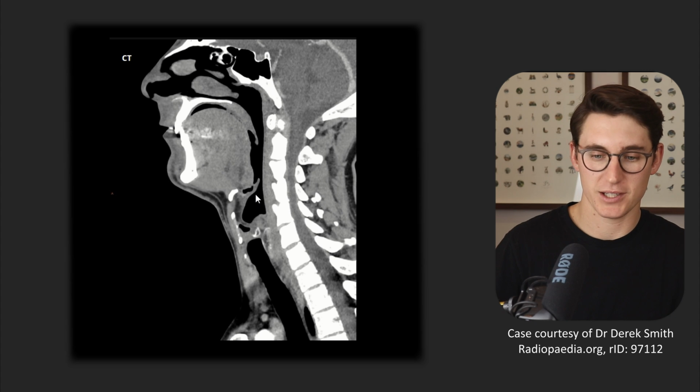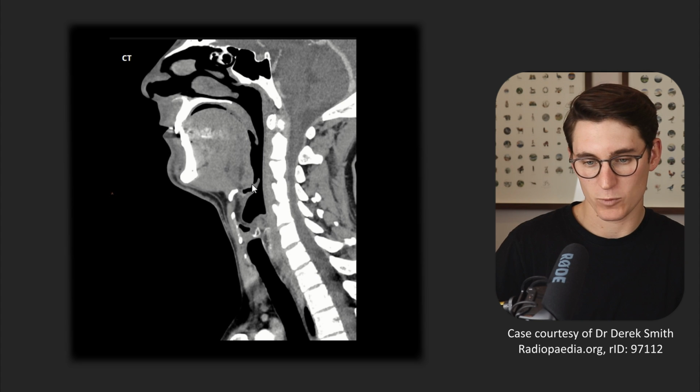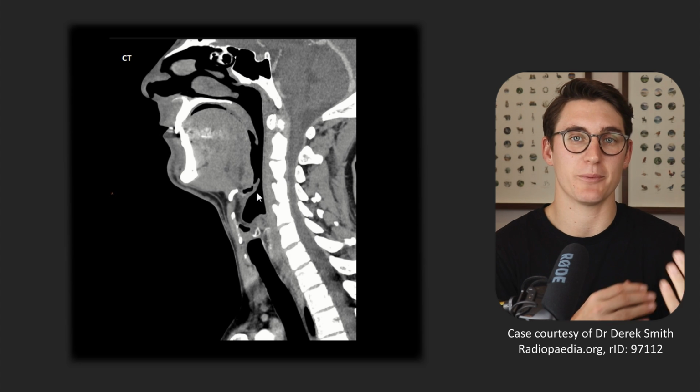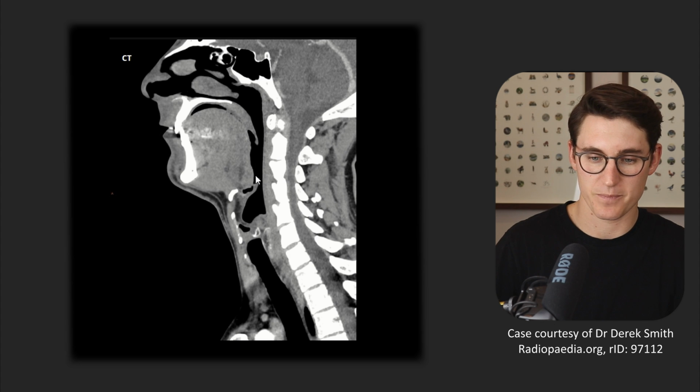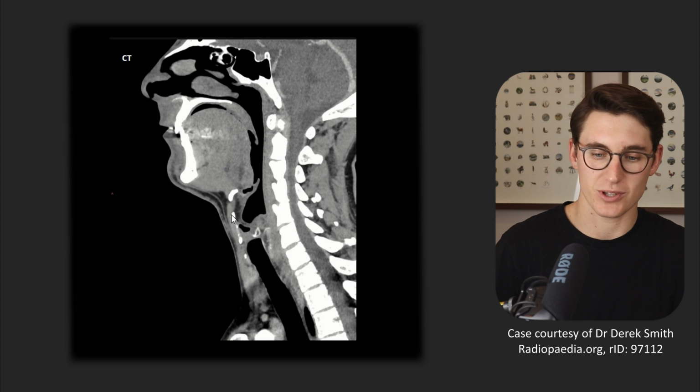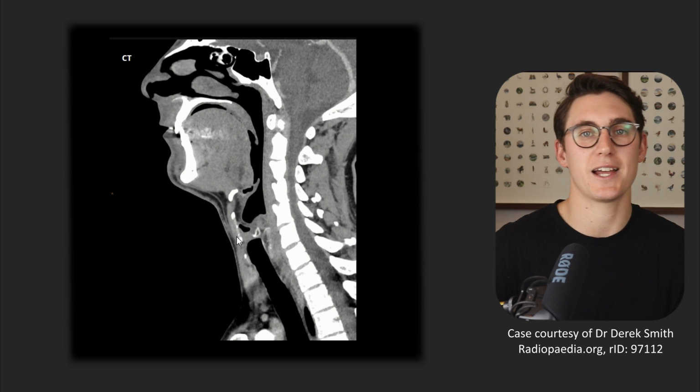As we go back to the midline now, we can see our epiglottis with our vallecula, those spaces anteriorly to the epiglottis and the base of our tongue here. And we can just see that median glossoepiglottic fold attaching the base of the tongue to the epiglottis here. The epiglottis has a free edge and it extends all the way down to its root where it attaches to the thyroid cartilage here.